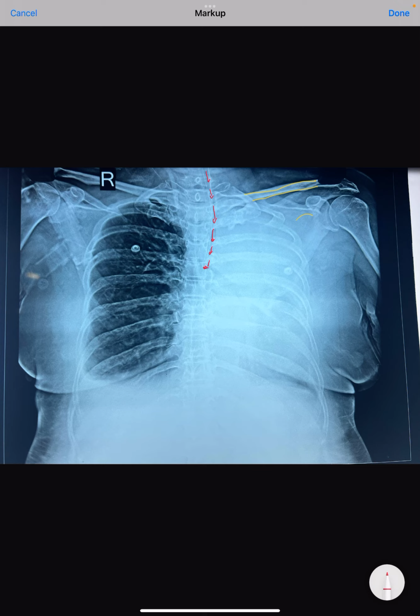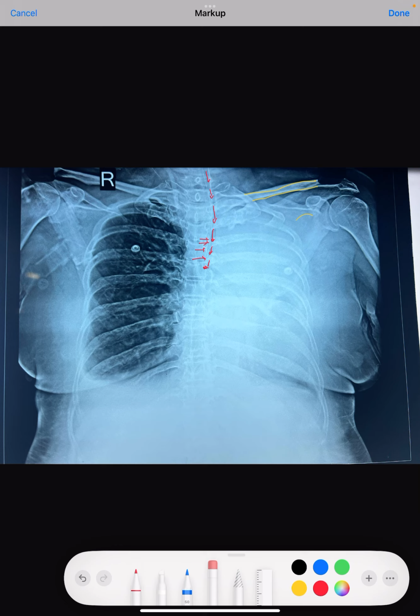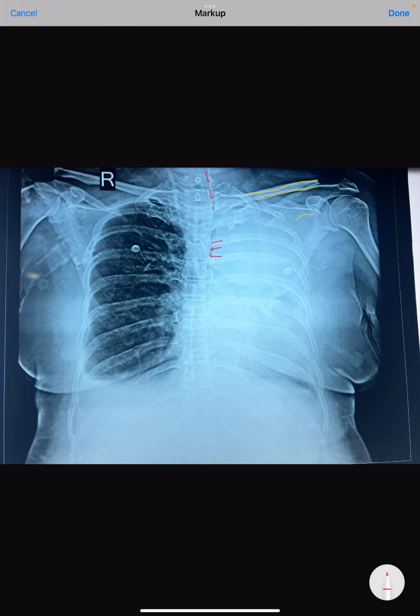So it is going down. You just see this, this is the tube. If you can see very nicely, very crystal clearly, this is the tube. This is the lining of the tube which we can see very clearly. That is the reason why it is completely blocking the left side of the lung. So the left lung is not aerated. At the same time, the mucus from the left lung is not suctioned outside. So it is blocking and causing all the radio-opacity of the left lung.